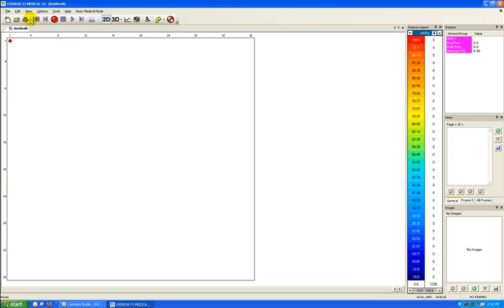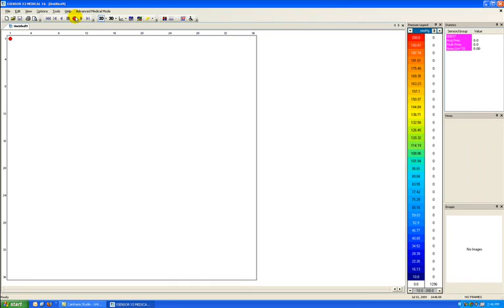Here in basic mode, we see a much more basic set of tools available to us, such as record, and then a variety of different views. It does also include the seating assessment guide, which is the major addition to Medical Version 6 software. However, to show you the full range of features available, I am going to switch back to advanced mode for the remainder of this training video.